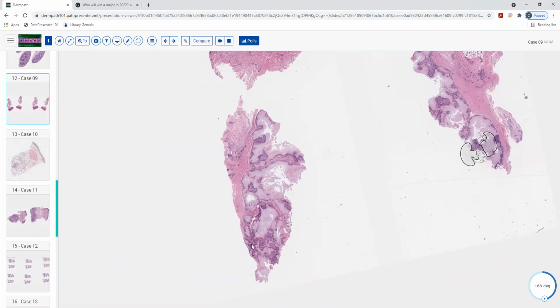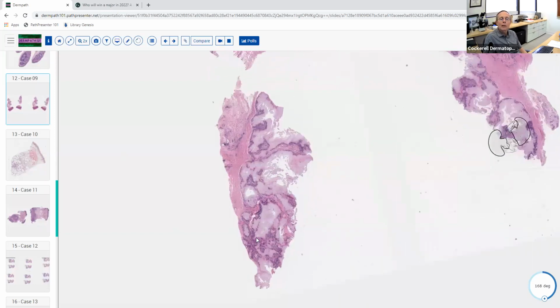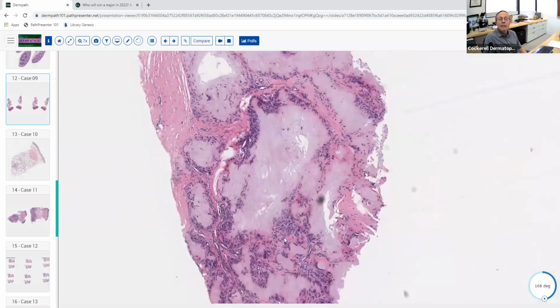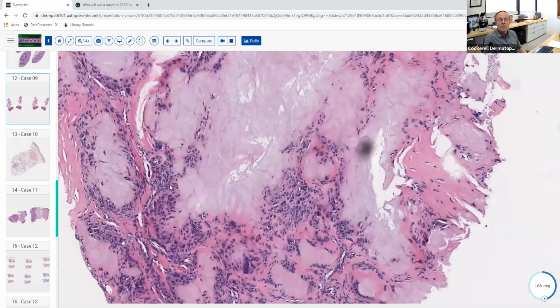They're not really black, so I would say not lymphocytes. Good, good. And they're kind of pale, aren't they? So they look relatively large even at low powers, but at higher magnification, you can see that there's some lymphocytes, but a lot of them are histiocytes.